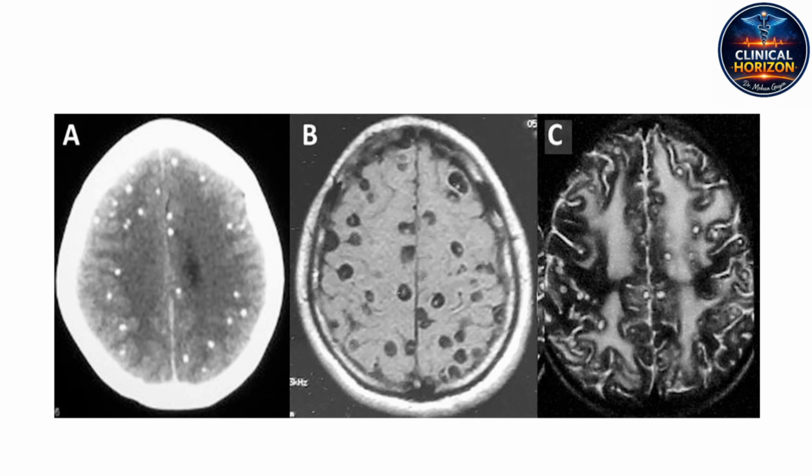Very profound. In regions where Taenia solium is endemic, a previously healthy adult presenting to the emergency department with entirely new onset generalized seizures will very frequently demonstrate this exact calcified pathology on a CT. Because the dots act like irritants. Those hardened hyperdense nodules are highly epileptogenic. They act as permanent physical irritants within the parenchyma, short-circuiting the local neural networks and triggering sudden, unprovoked electrical storms in the brain.